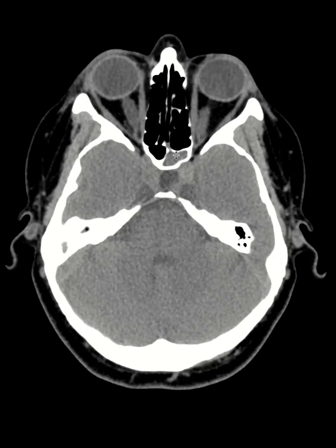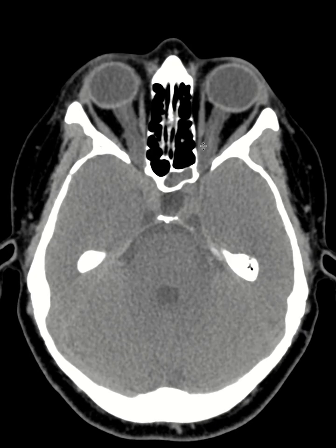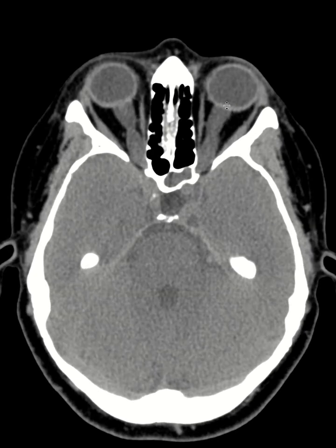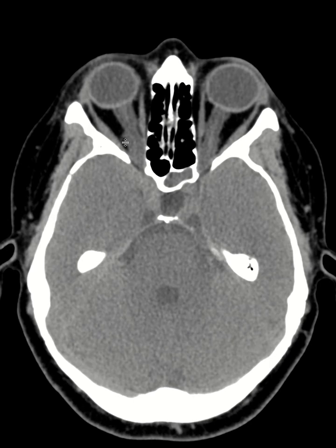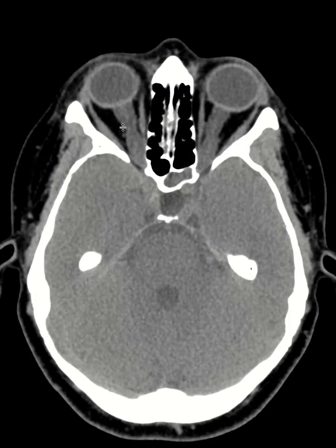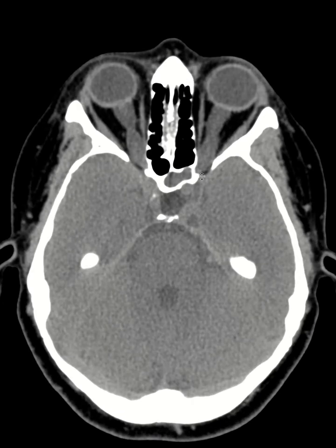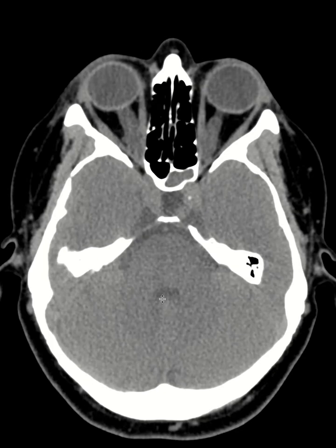If you just focus on the orbit, you see a massive enlargement of the optic nerve sheath CSF spaces. So if this is the optic nerve, you see that the optic nerve sheath is markedly prominent and enlarged. There is also a little bit of tortuosity of these optic nerve sheaths. This is very unexpected for a 40-year-old patient. Okay, so far it's pretty non-specific. I don't know what's going on, and this is a non-contrast CT.